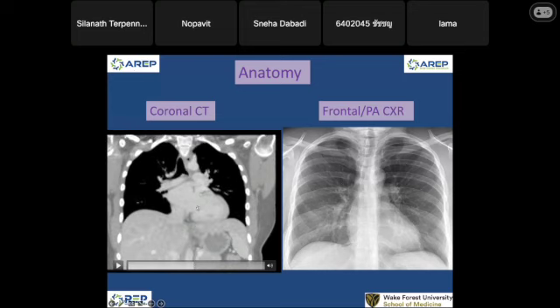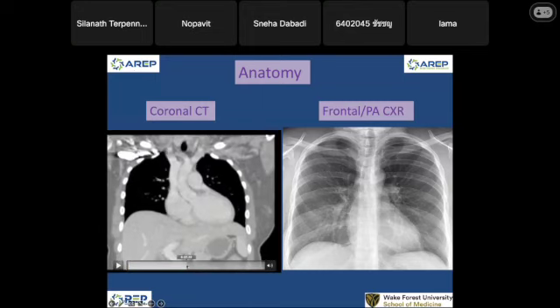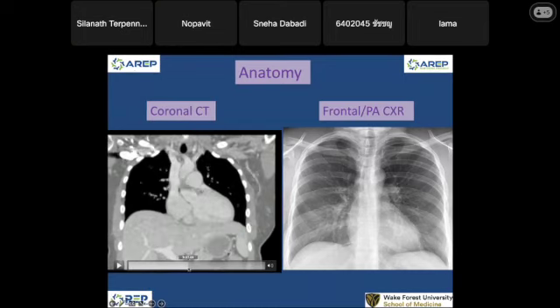This is my mitral valve. From the left ventricle, it will go out into the left ventricular outflow tract. This is the left ventricular outflow tract here, and this is the aortic valve, and this is the ascending aorta. So the ascending aorta is feeding our body. At the aortic arch, there are three branches. The first branch here is the right innominate. And the right innominate will divide into the right common carotid, this one, and the right subclavian artery, this one. Okay, that is the first branch.